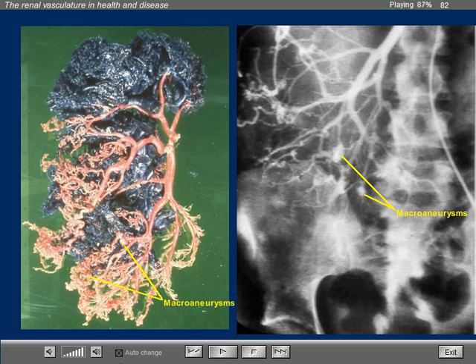The hypervascularity of the angiomyolipoma in the parenchymal phase of an angiographic study may mimic a cancer. However, we do not see arteriovenous communications in angiomyolipoma, nor do we see obstruction of the veins, findings that are common in cancers of the kidney.